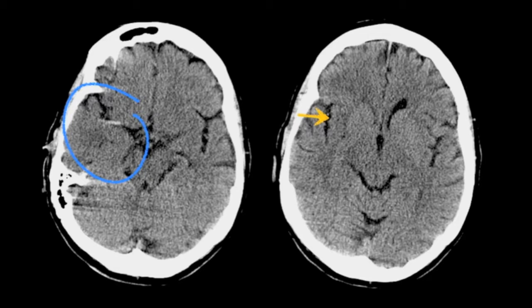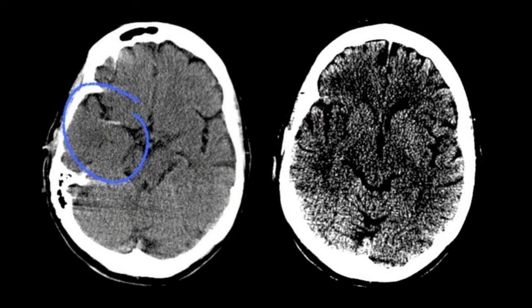This is difficult to appreciate on standard windowing of non-contrast CT, but can be made more conspicuous by narrowing the window. Here we can see loss of the grey-white matter differentiation, particularly affecting the insular cortex. This is nonetheless subtle, but is worth seeking, as in many cases the hyperdense artery will not be visible, and this may be the only sign available to confirm the presence of an acute infarct.